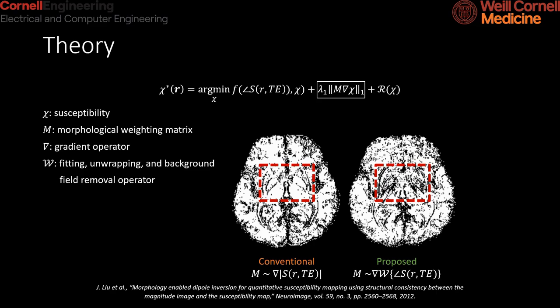The black voxels are zero-valued and not penalized by the cost function, so they represent regions where edges are permitted in the final susceptibility map. Notice more voxels are permitted to contain edge information in the proposed phase prior mask than in the conventional magnitude prior mask.